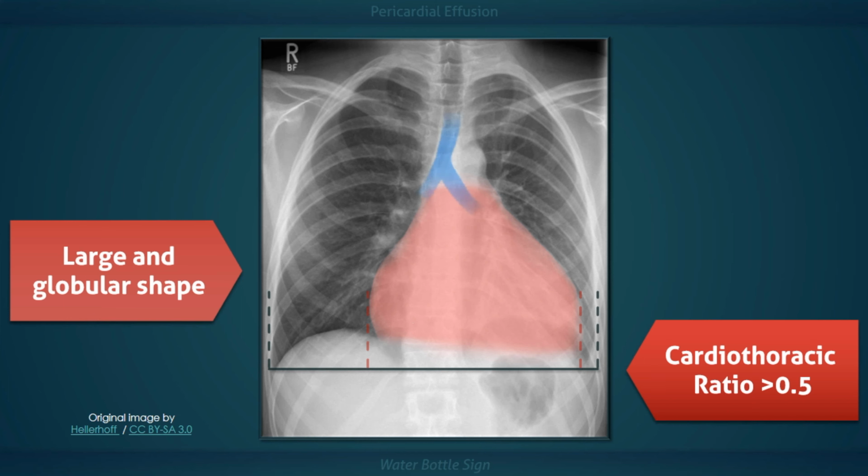And finally, inspection of the airway reveals that the lower trachea is not quite vertical and that the carina appears to be displaced to the right. This appearance can occur if the X-ray was performed while the patient was rotated to the right. As well, encroachment of the engorged pericardial sac on the lower airway can also push the carina away from the midline.